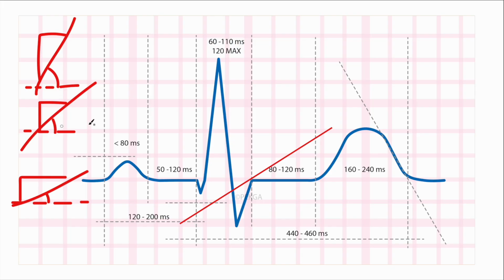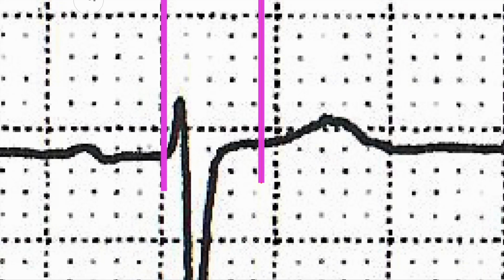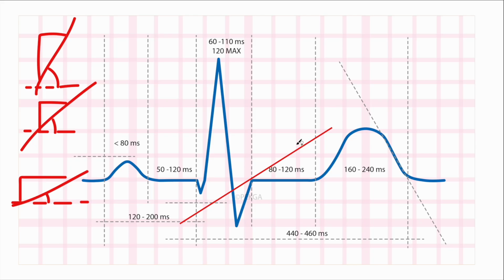So what happens is, on this ECG here, well, let me go back to this one, sorry, real quick.